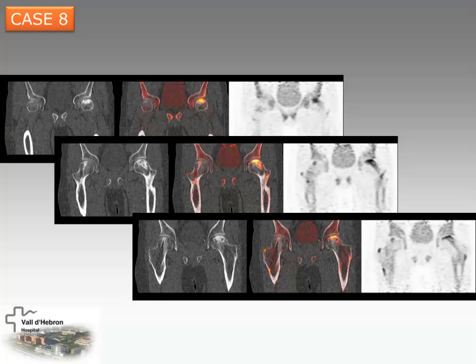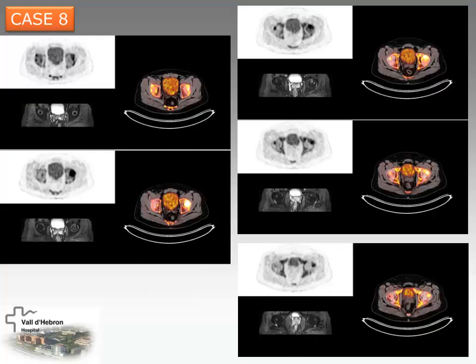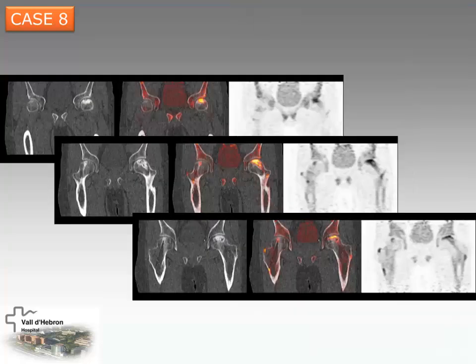It was an osteonecrosis treated with forage and stem cells. Which is the best hip? This one, okay? And here you have the coronal images, and here the transversal images, and you can see very well the different degree of bone reconstruction in both hips. You have the CT, here the magnetic resonance. The magnetic resonance doesn't detect very well all this bone reconstruction. Okay?